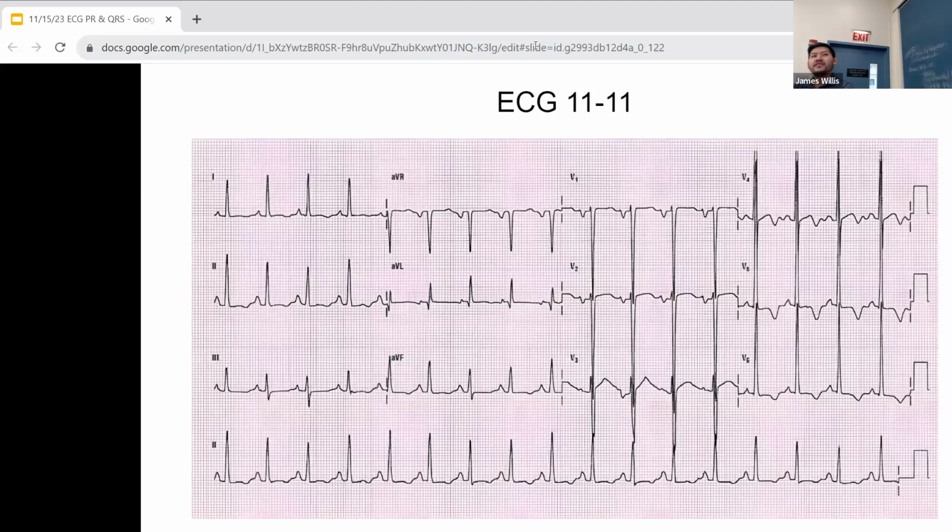Jane says sinus rhythm. Nice. What's abnormal or eye-popping? Tachycardic, yeah. I guess that's concerning. Electrical alternans. Maybe, but it's pretty high voltage. Thin person, yeah.